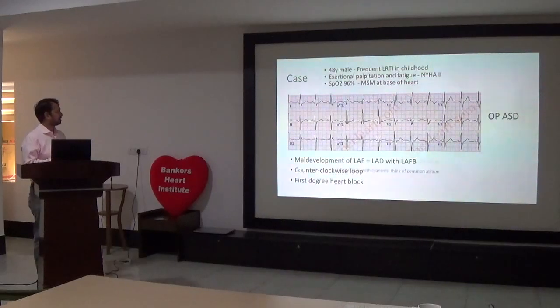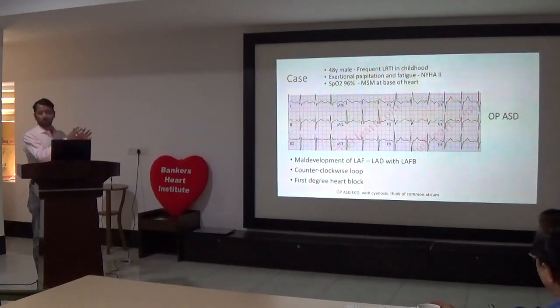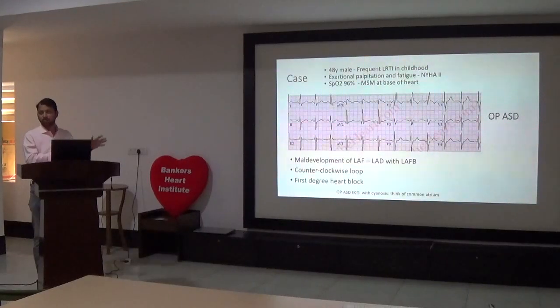Basically, this is a classical ostium primum ASD, but the specific feature I want to highlight is there is an RBBB pattern with left axis deviation, that is LAFB. This pattern can't be ignored in ostium primum ASD. It can be associated with first degree heart block.